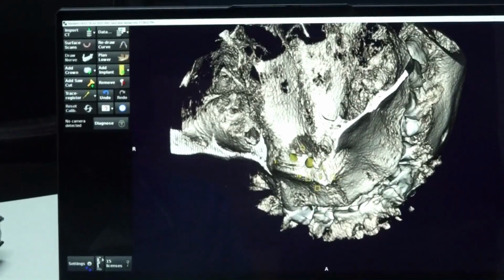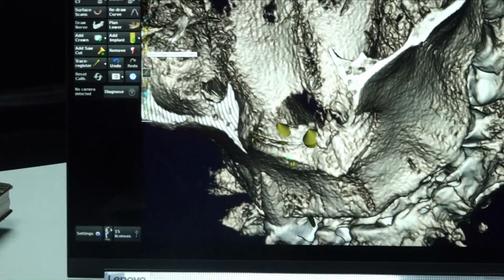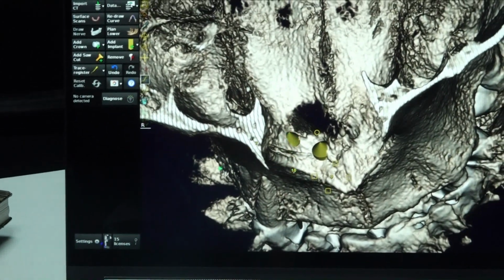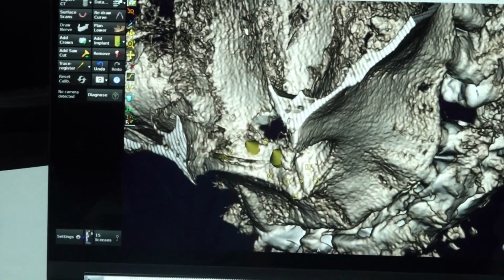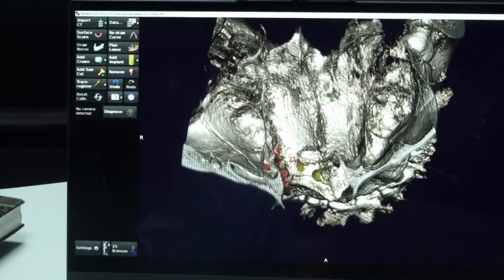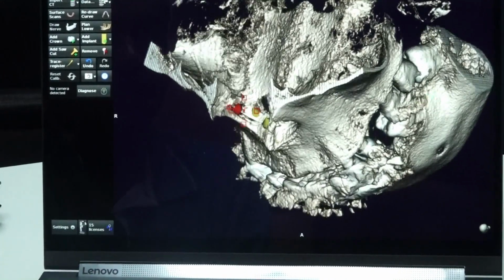See, this is from the preview. This is the 1-1 implant exiting the nasal floor. This is the 1-2 implant. Then the 1-5 implant we will place. The 1-5 implant is almost in the nasomaxillary buttress area.